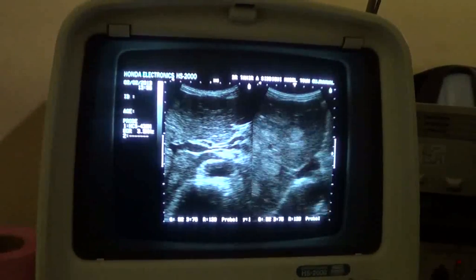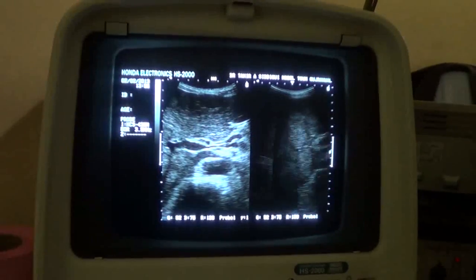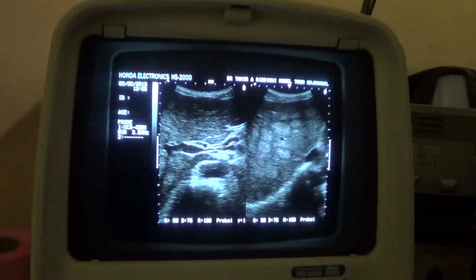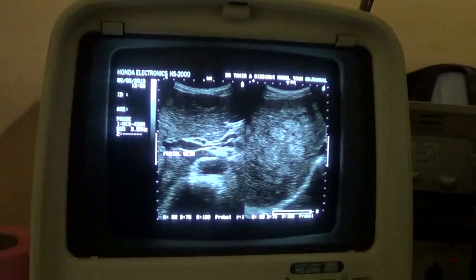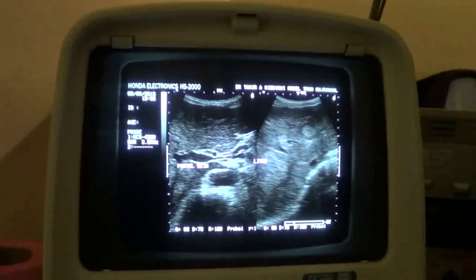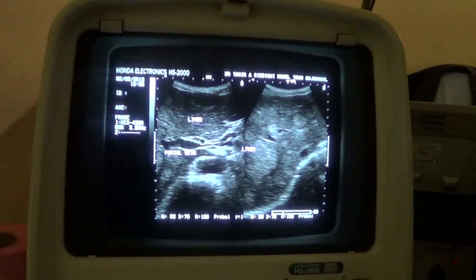These are all metastatic lesions, diffuse metastatic liver disease. In an otherwise normal liver, not cirrhotic, except that the liver is enlarged.